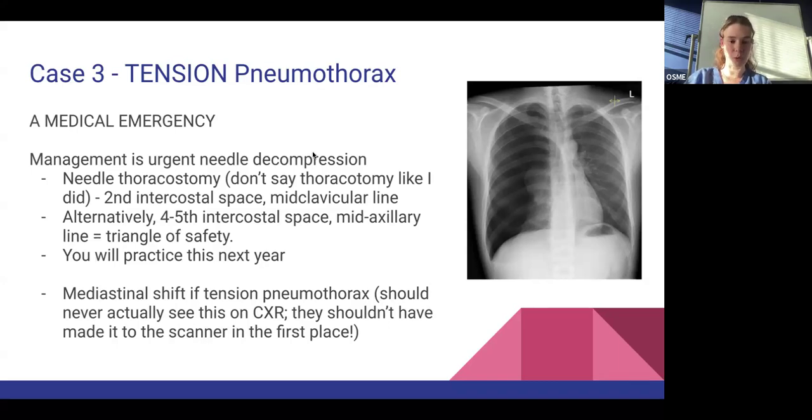If it's a tension pneumothorax, you will see mediastinal shift, which is what we've got here. So very clear. I think the lung's coming in at around here. It's all bunched up. That's where the lung markings end. So a huge loss of lung volume here, and all of this air with every single breath is pushing and pushing and pushing. So we've pushed the heart right over here, and you've still got those lung markings here. That's how you know that that's not the affected lung.